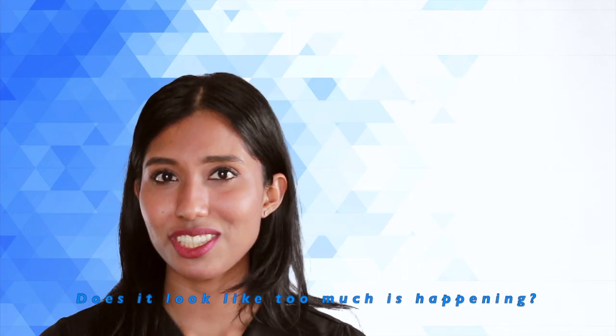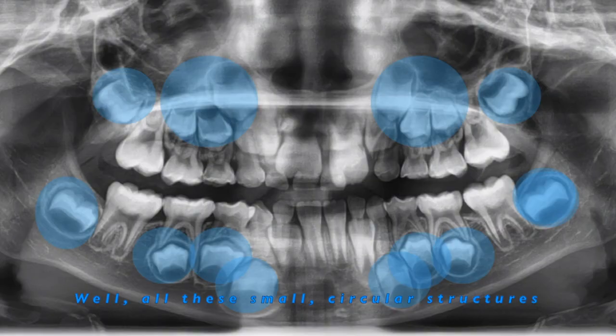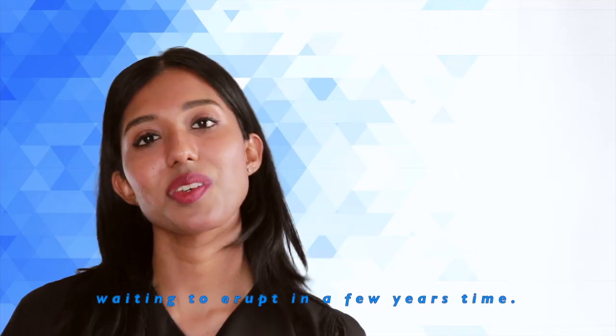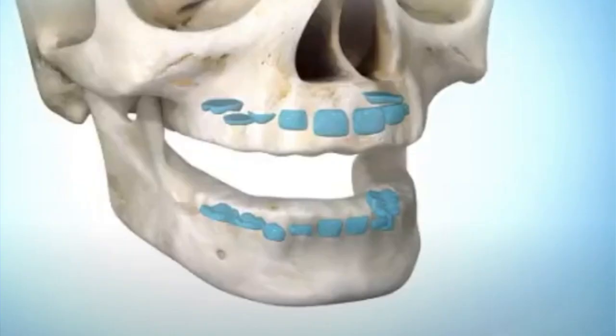Does it look like too much is happening? Well, all these small circular structures you see within the jaw bones are actually developing permanent teeth waiting to erupt in a few years' time.